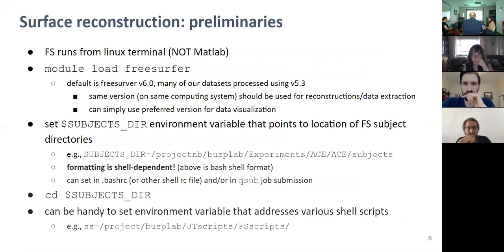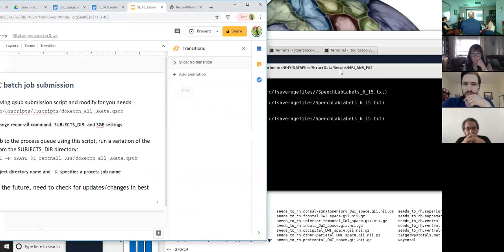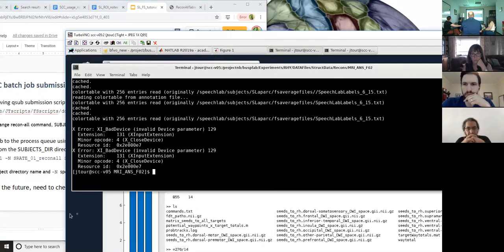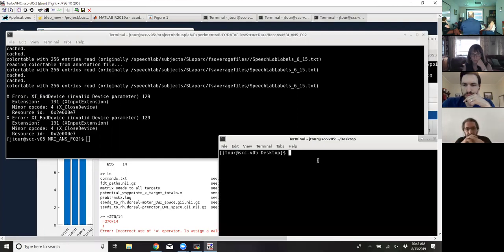Do you want me to plug in and do that? Just to set those, I can do that now. Let's say I did this first. I open a new terminal. Okay, then let's say I was going to work on the, let's say ACE.